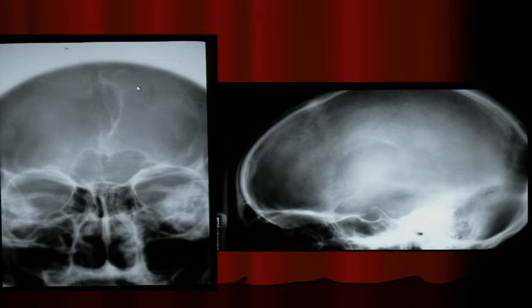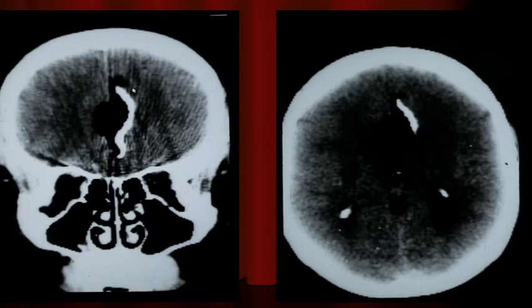So if you saw this, you would go to a CT. And the CT shows this calcification. This is not CSF. This was actually about minus 100, so this is fat. What lives here? Corpus callosum. What can the corpus callosum get? Lipomas. What do lipomas often do? They can calcify. So this was a calcified corpus callosal lipoma, and they can also get partial agenesis of the corpus callosum. So if you see a corpus callosal lipoma, there may be partial agenesis of it.